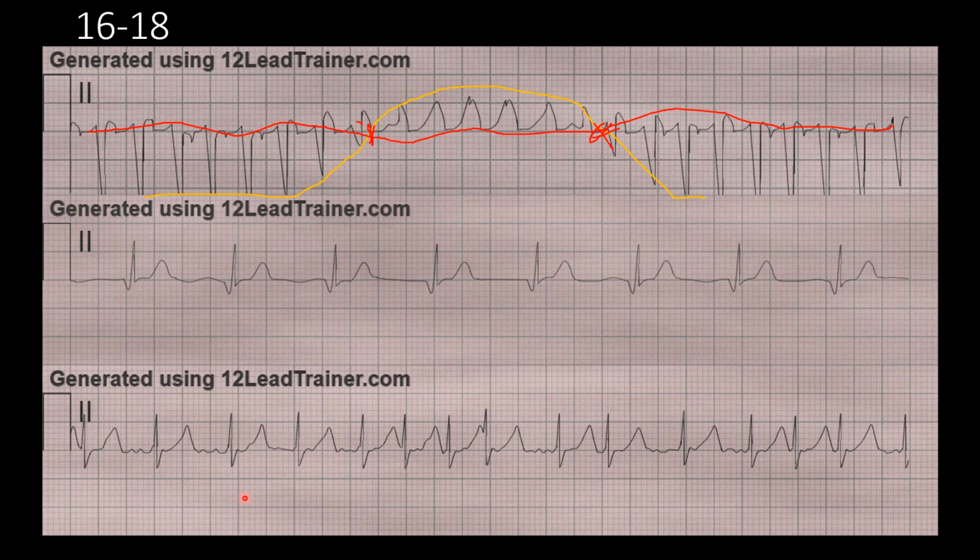Our QRS is within normal range at about 0.08. No P waves from what we can tell. No PRI, and we already did all that. So now we can name it. This is atrial fibrillation with RVR, meaning rapid ventricular response, or uncontrolled, because it is over 100 beats per minute. So uncontrolled AFib or AFib with RVR.